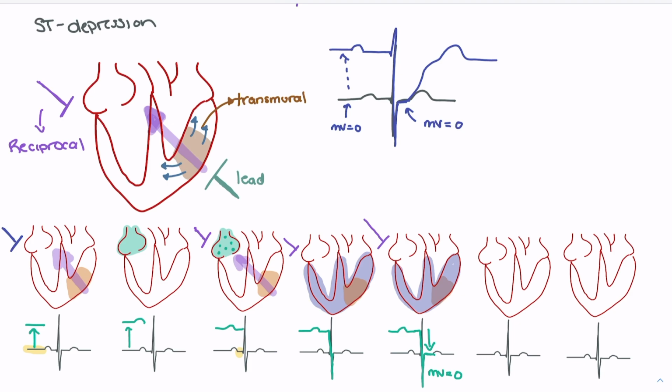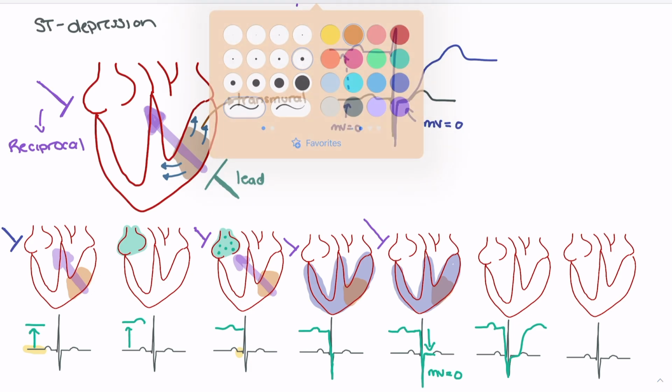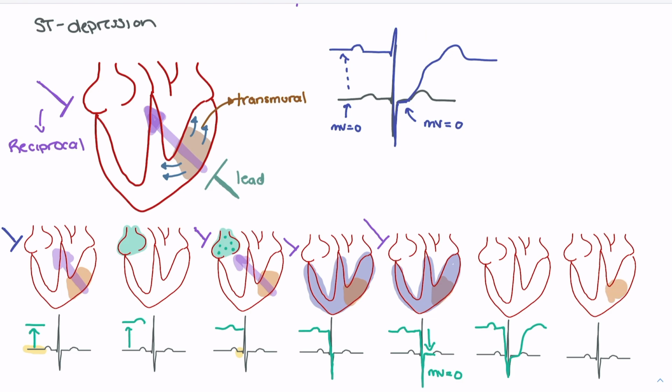Now, as we have our T wave, we're going to see repolarization of the ventricle, then we're going to move back up. As the ventricle repolarizes, we have our T wave, and then we're going to go back to our baseline, which, remember, when someone has a transmural infarction, is being generated by that injury potential. So now we're back to having no real movement of ions from the myocardial tissues, other than the movement that we're seeing from that injury potential.